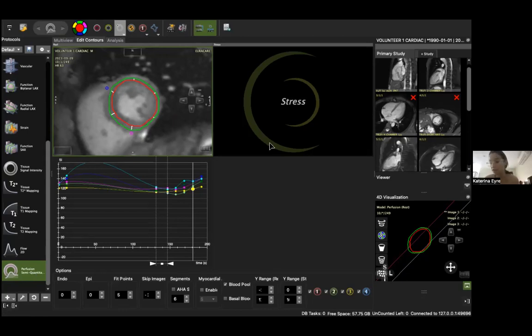So there's a trend in general. A positive change in signal intensity over time indicates that the person has a normal microvasculature, because as time goes on after the hyperventilation, the vessels go from vasoconstriction to vasodilation, and there should be a rush. It's like, as an analogy, opening the floodgates. So there should be a rush of oxygen, which should increase the signal intensity.